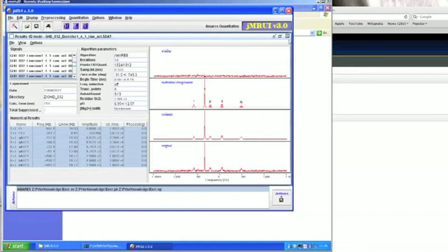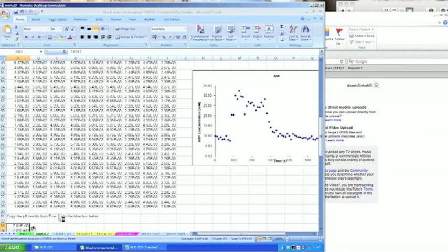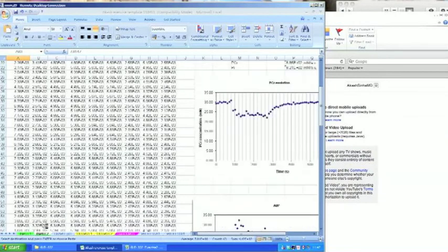So that's exercise 1. This is the 20% of maximum voluntary contraction exercise, where you're really looking at PCR depletion and then recovery. The next one is 30% MVC, where you're looking at the anaerobic process, particularly how low the pH falls in that one. But we'll do that. So I'm closing. Right, so that's done now.